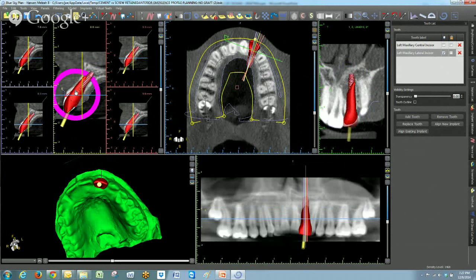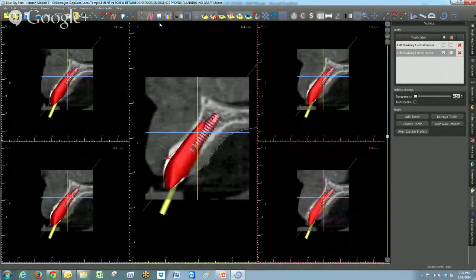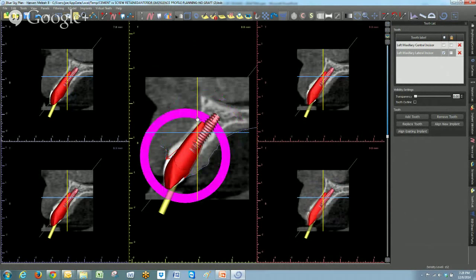Now, one thing we can't control on these teeth is the angle of the root. And what we're really interested in here is getting the coronal, the clinical crown lined up, superimposed over the crown that doesn't have a root on it. So if you look in the top right picture, you'll see that this tooth is aligned in between the adjacent tooth nicely, and we can determine emergence profiles right here. So here's the top of the implant, and I'll get rid of these. I'm gonna draw another line on that. Okay.